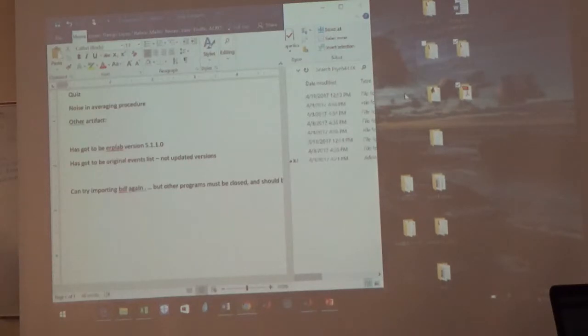once that's downloaded, we're going to have to paste that into our EEGLab plugins folder. It will not let us delete the existing version because it's being used by MATLAB right now. So we need to shut down MATLAB, just X out, kill all of MATLAB.